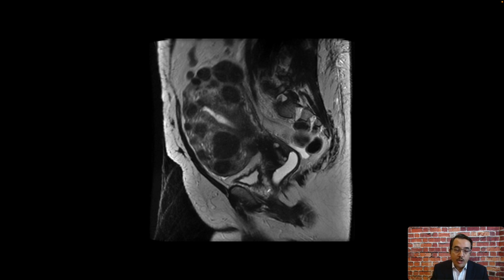The next slide shows a single sagittal T2-weighted image from a patient's MR of the pelvis. The uterus is enlarged. This is the endometrium. We see multiple scattered foci of T2 hypointensity. These are consistent with fibroids. The other findings include Nabothian cysts in the cervix, vaginal distension with ultrasound gel that is used as contrast, some free fluid in the pelvis that could be physiologic in a woman of childbearing age, and we see T2 hyperintensity of urine inside the urinary bladder.